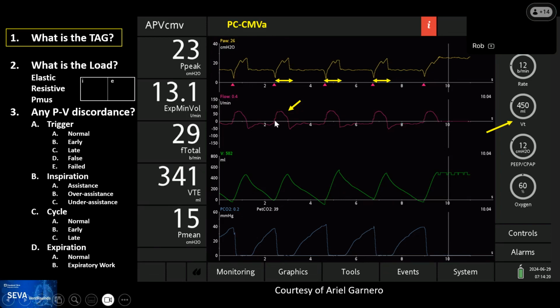because we look at the flow waveform, right? That's where our eyes go first. You say the flow waveform is highly irregular. If it was volume control, it would be some kind of regular geometric shape. It's highly irregular, and in this case, it's even deformed, so it's concave downward. And so we know that there's some active inspiratory effort on top of the pressure control.